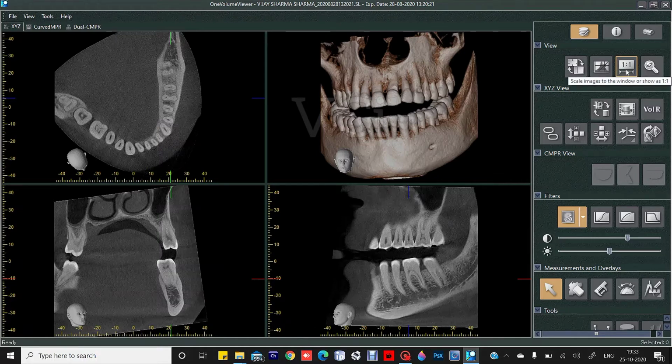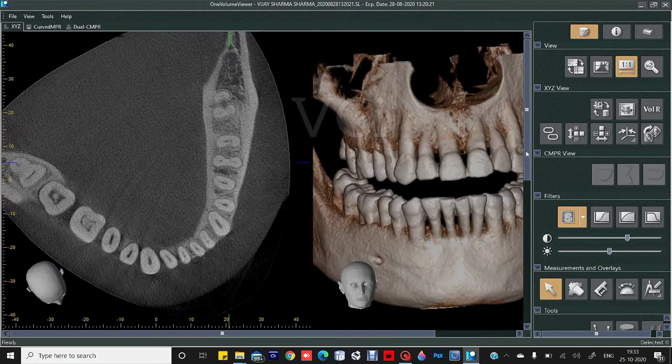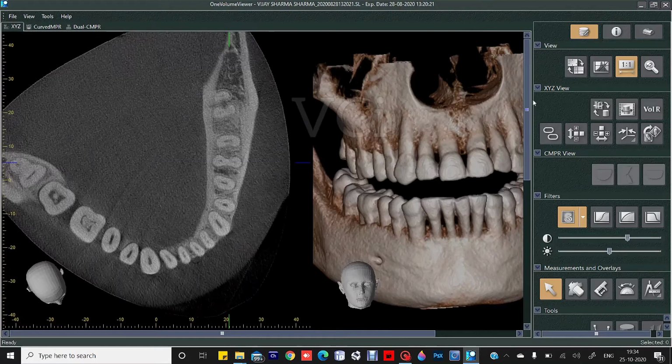Now this is see your images in 1:1 ratio. So now the images which you are seeing here, you have these black borders around. So just to see the images in 1:1 ratio, you just have to press this, and accordingly you see the black borders are also hidden, and now you can see the images in good manner, and in their magnified images.